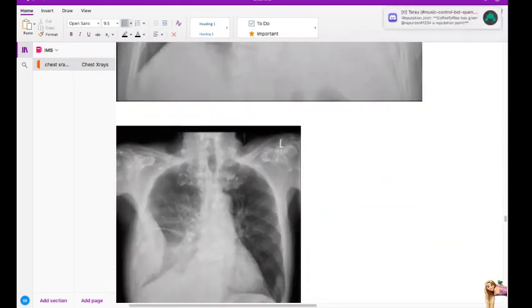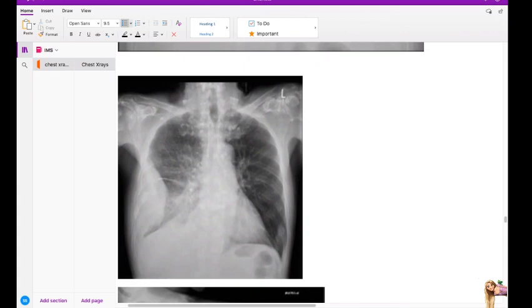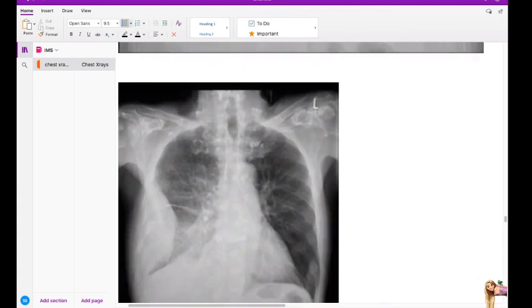Thank you, coffee. Okay, then we go to the next X-ray. What do you guys see in this one?